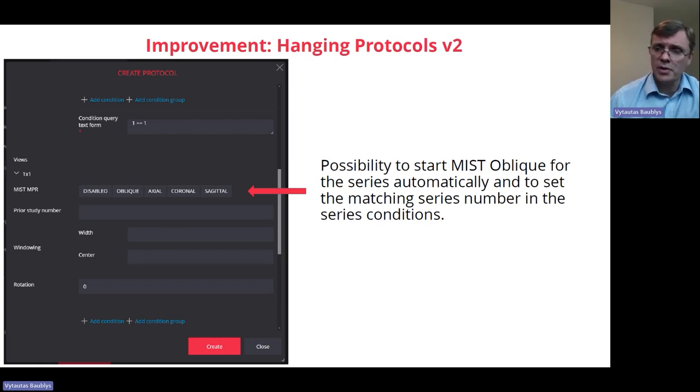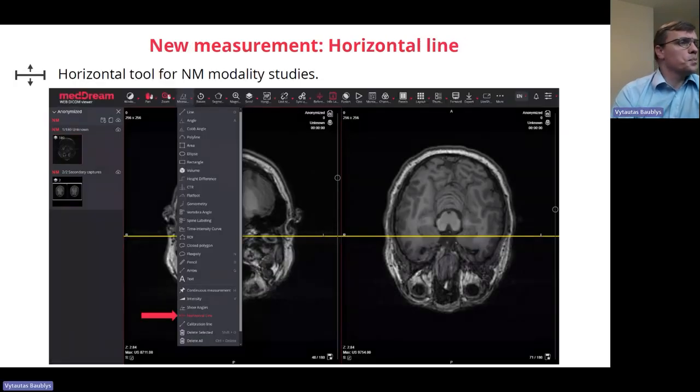So the functionality will be upgraded, and because we are changing how we handle the screens, some significant changes are still coming. So all the hanging protocols which you create will be mostly valid for 7-8 months, because after the next upgrade you will still need to put your fingers in to make the system even smoother.